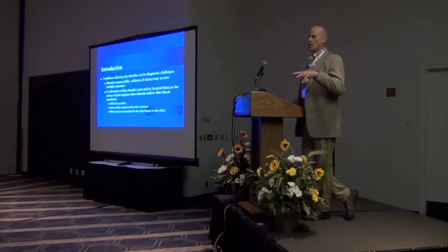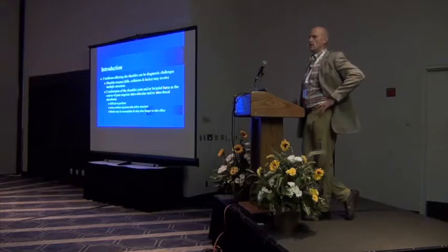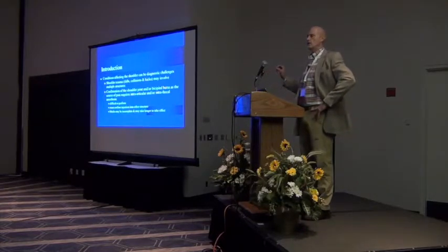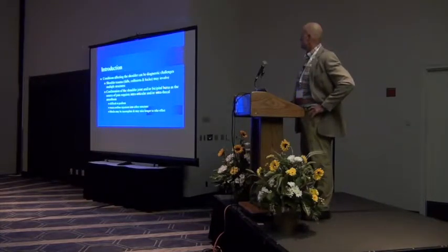And looking back on this particular topic, it's absolutely amazing to see the change in our technology and the improvements in how we can radiograph this region over 10 years. It's remarkable. This was older radiographic technology. So we had CR, and before that film screen, and now we're in the digital age, and there are even light years ahead on some of the different imaging technologies available to us.